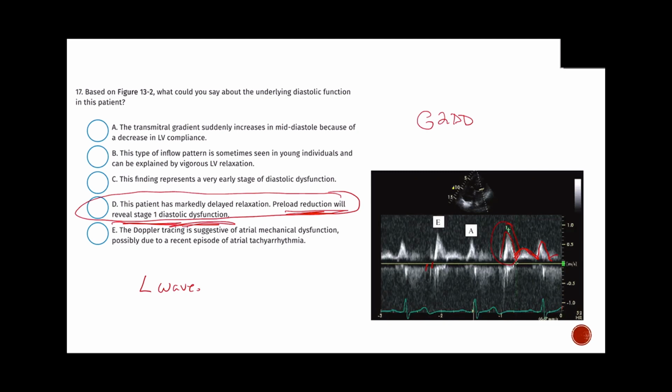Cool. So you'll see clinically at the bedside someone who you think is volume overloaded. You have a grade 3 diastolic pattern. You diurese them aggressively over a couple of days, and now they look like a grade 2 diastolic dysfunction. And you're like, oh, interesting. They were having higher filling pressures.